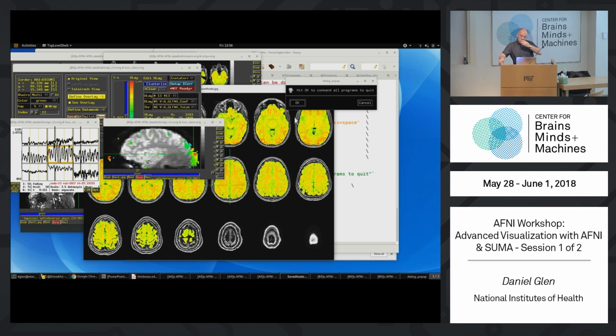What you were editing for @drive_afni, we ran it on the class data. Can you specify drive commands for different things, different data sets? Like, I want a rat data set. Yeah, so this is just an example script. @Drive_afni is just an example. plugout_drive is going to be the tool that you're going to use inside your own script. So this is just made for the class data as an example. If you have marmosets or macaques or humans of different studies, you're going to have different kinds of scripts most likely for each of those data sets.